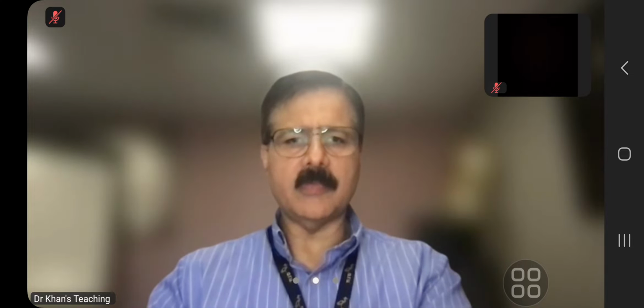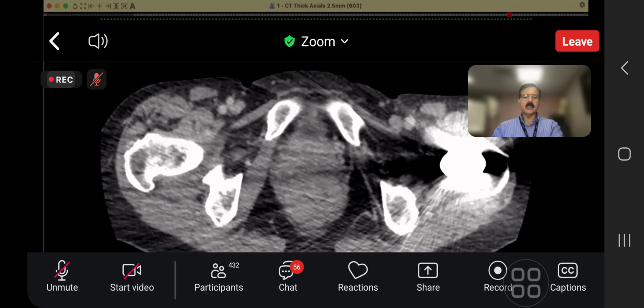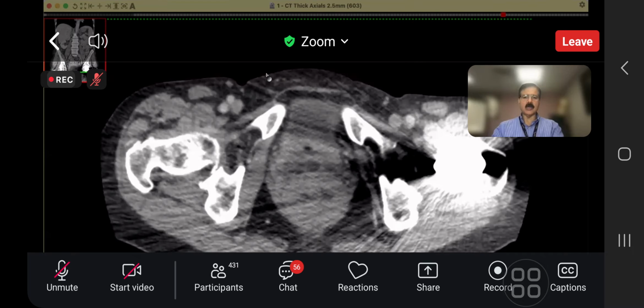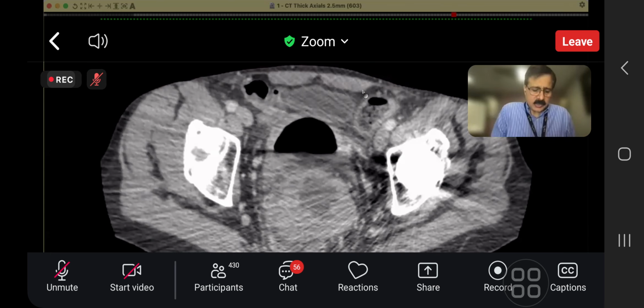In this case, generally speaking, it was quite tricky on the CT scan, but a bit of fine touch. Now, on the CT scan, please also remember in the exam, particularly in the long cases, in the viva also it happens, that the examiner gives you only some sequences.